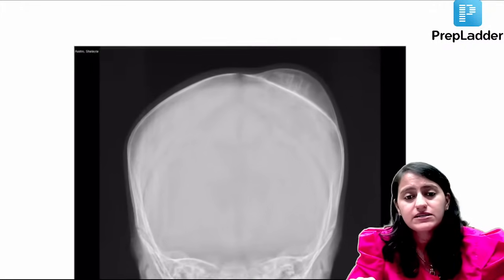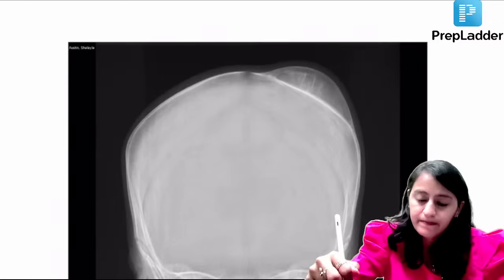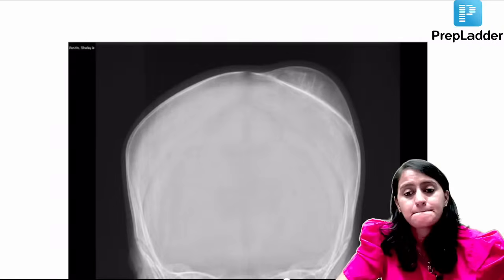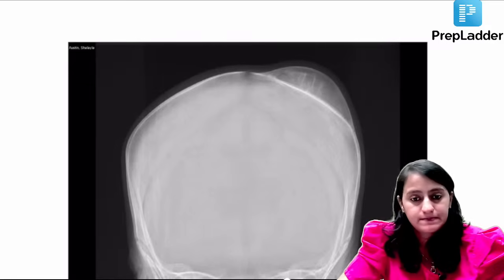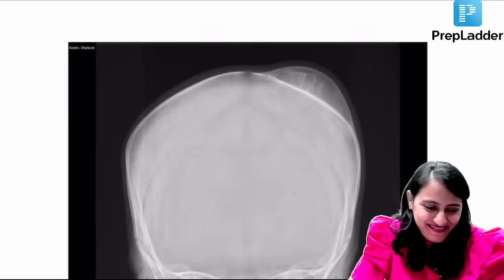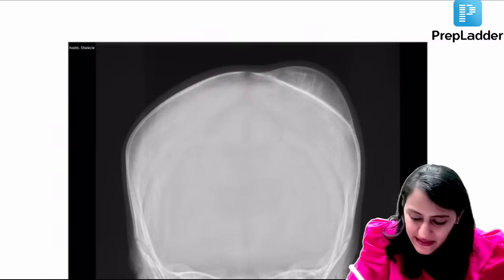Next one here: is this caput or is this cephalhematoma? This is not crossing the midline, right? This is the midline that you are seeing here.